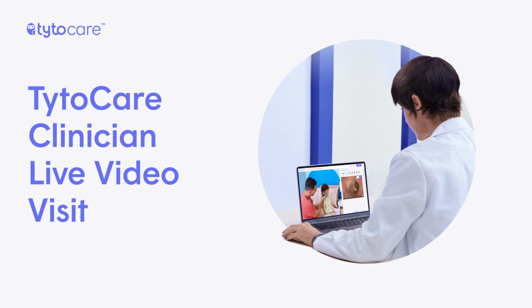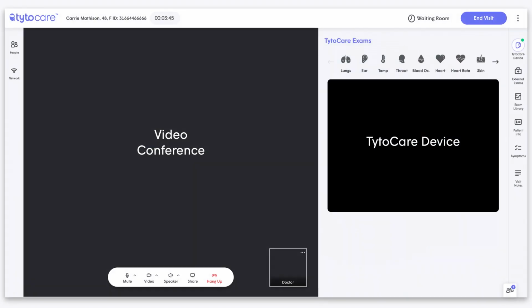Welcome to the Tytocare Clinician Live Video Visit View. In this short video, we'll show you how to perform a live video visit with a patient using the Tytocare platform. First, let's review some basic visit options.